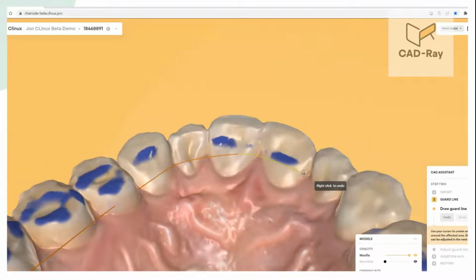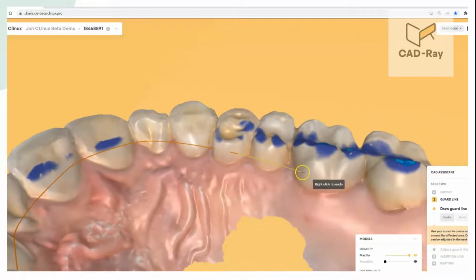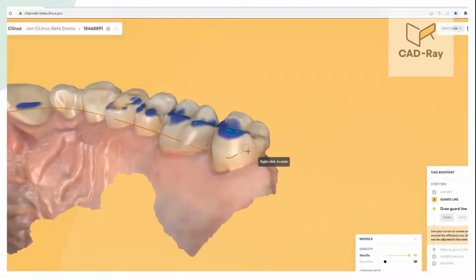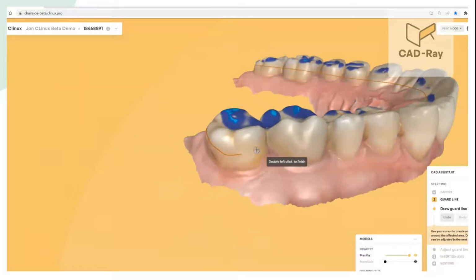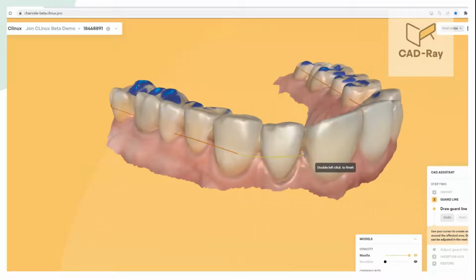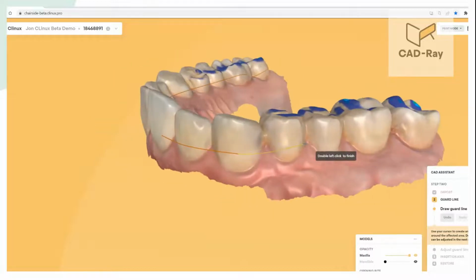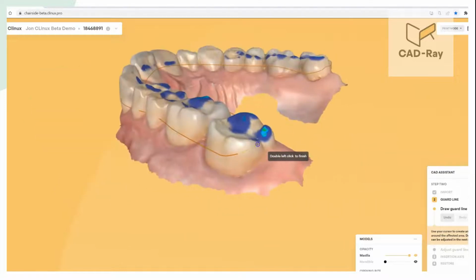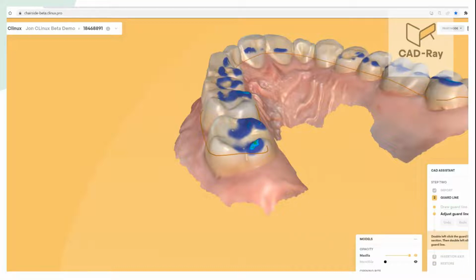You, as the user, have 100% control over where on the teeth you would like the Nightguard to finish, the final position of the guard. Notice how the camera view switches around with us as we make clicks, so there's no reason to rotate the model or do anything manually. We can just keep clicking along and input the final position of the guard with single clicks. Anybody can learn how to use this software and design a Nightguard in a matter of moments, literally just by watching this video. Double click to finish when you get to the end of your guard, and then click the next button.